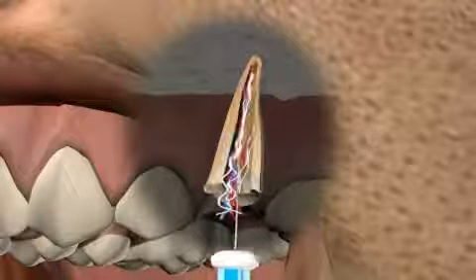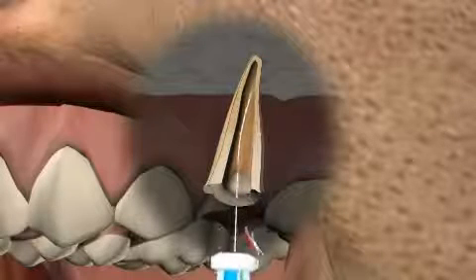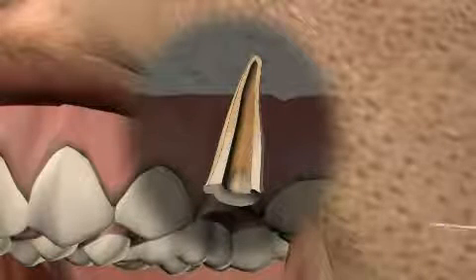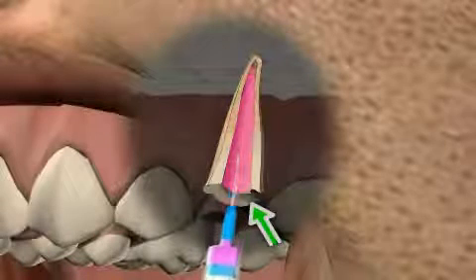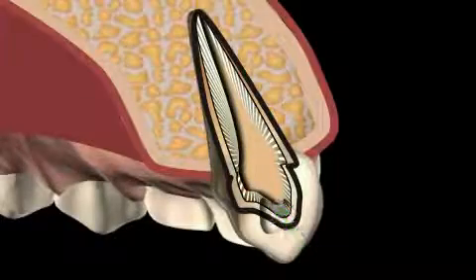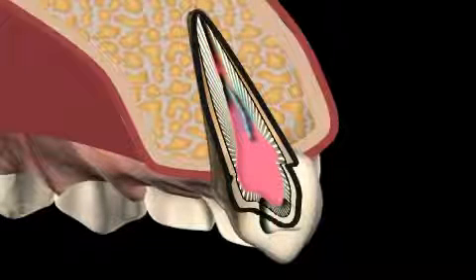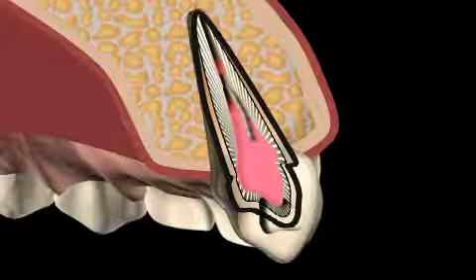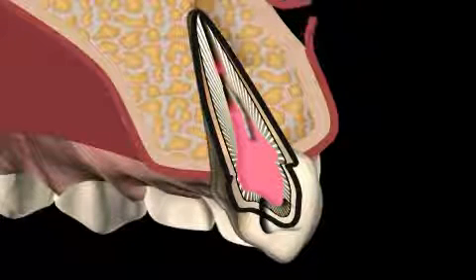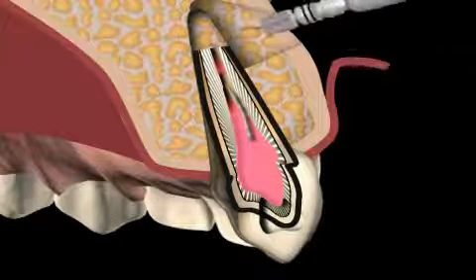During orthograde root tip resection, canal cleaning and filling should be done from the top down. In other words, from the tooth crown down. There will be more about this in the video by the same name. Sometimes access from above is not possible, for example on pivot teeth, or if a root canal instrument is chipped and stuck in the tooth interior. Using the retrograde root tip resection, the tooth can be cleaned and sealed from below, meaning from the capped root tip. There will be more about this in the video by the same name.